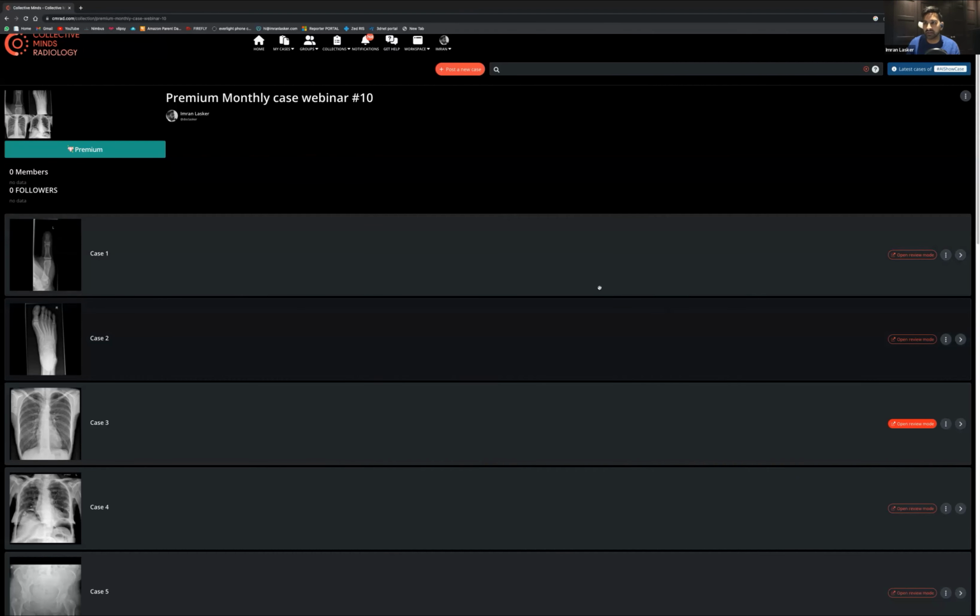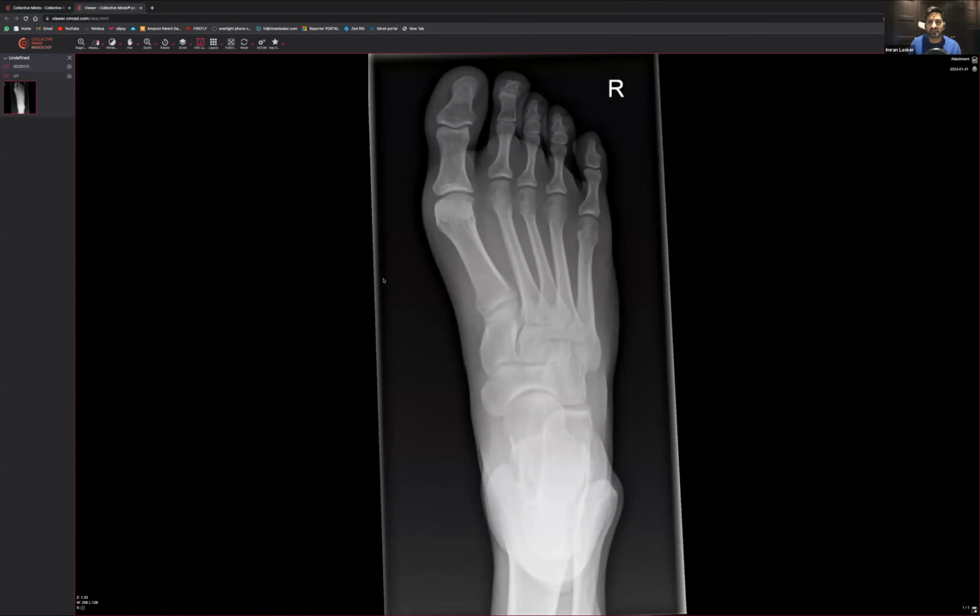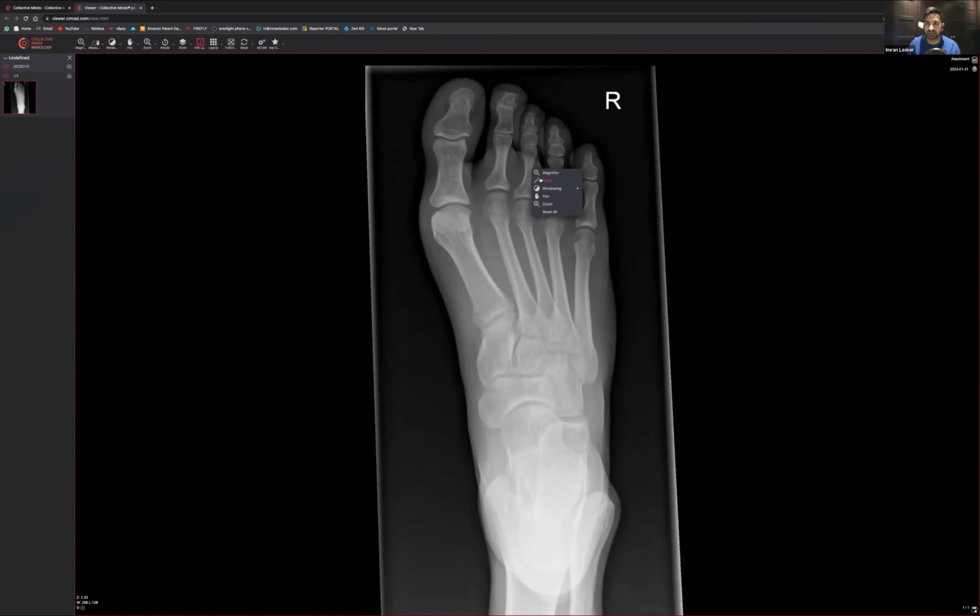So someone is asking how to tell whether there was soft tissue swelling on, where was it? So how can you tell if there's too much soft tissue on the metatarsophalangeal? I'm quite desperate to answer that. So I'm going to open that one. So it can be difficult. It depends on the age of a fracture. On the metatarsal, it's very, very difficult to see whether there's a soft tissue swelling on the foot, because, you know, you're looking at the soft tissue areas over. Okay, let's get the pen here.